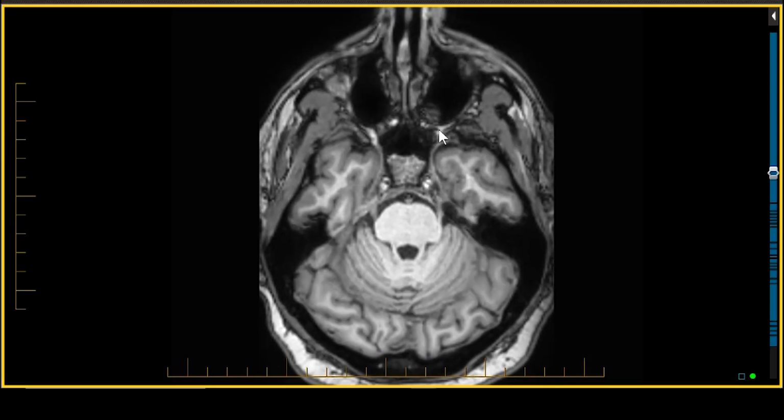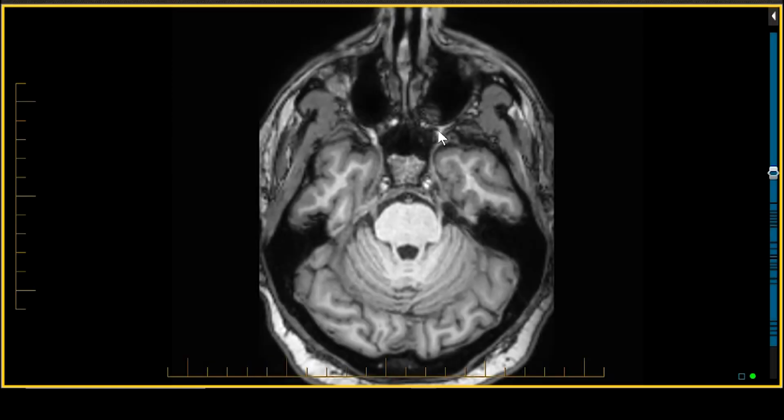And in the upper third of this little fat-filled space right here, behind the maxillary sinus, as we've scrolled from up, or craniad, the inferior orbital fissure, to down, we've reached this important landmark where the pterygopalatine ganglion will live, also known as Meckel's ganglion, the nasal ganglion, and the sphenopalatine ganglion, lying in a little fossa or pocket known as the pterygopalatine fossa. Now, this ganglion has multiple functions.